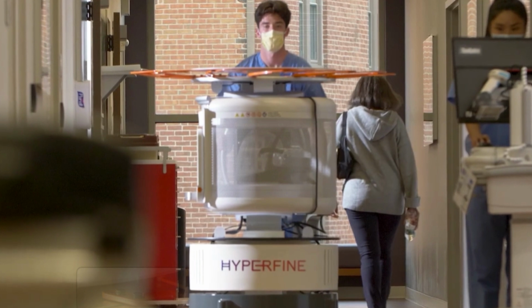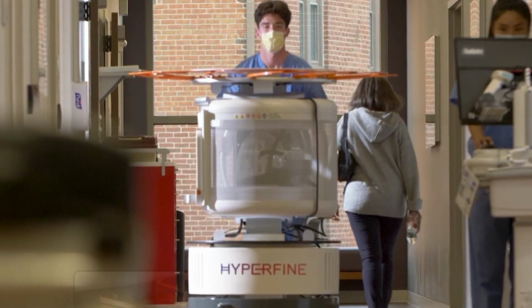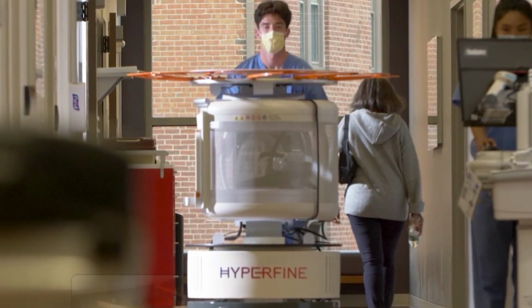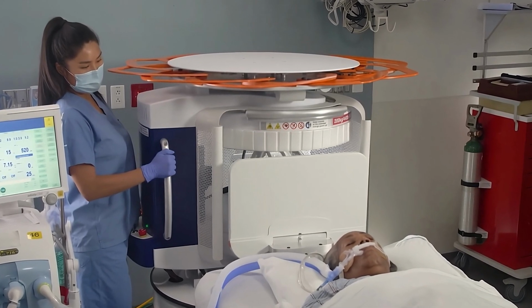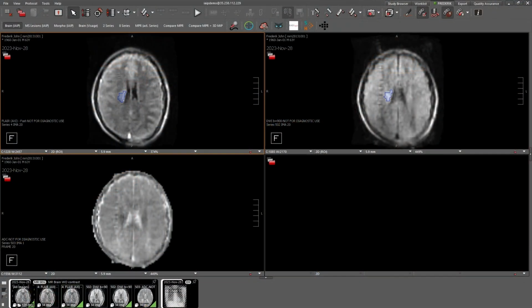The cool thing about our Hyperfine is that it is a low field strength of 64 millitesla, much less than the typical 1.5 or 3 Tesla scanners that we are used to. Thus it is safe to be used in a patient's room with other medical devices, ventilators, poles, medications, visitors, and staff. In this clinical scenario we obtain non-contrast T1, T2, DWI, FLAIR, and ADC images as part of our stroke protocol.